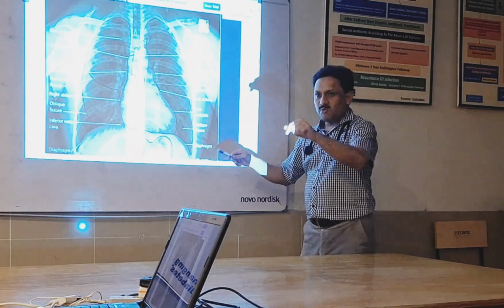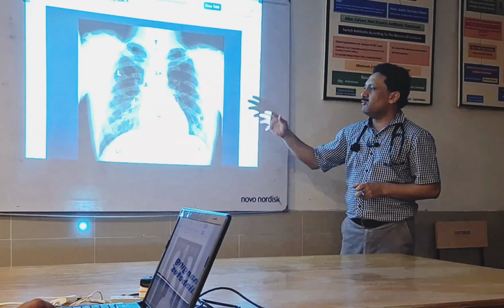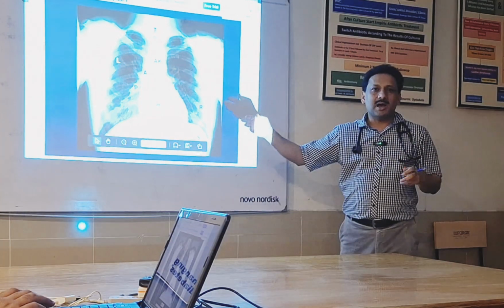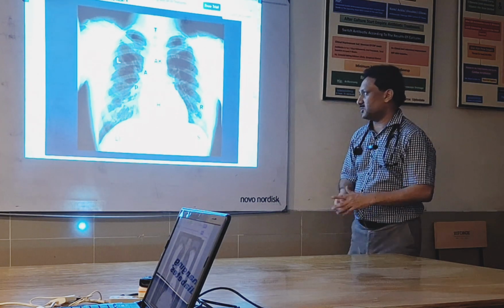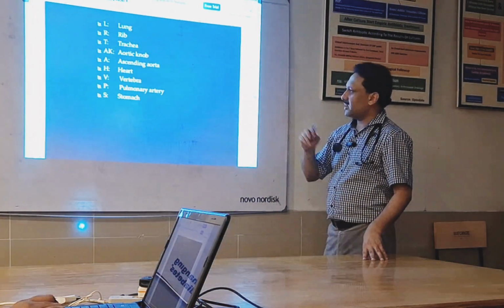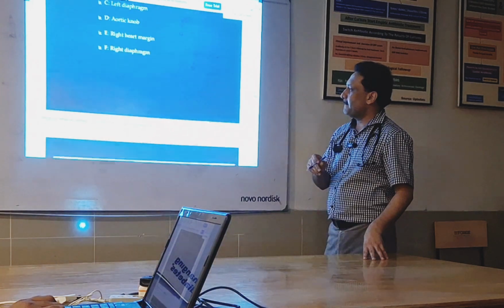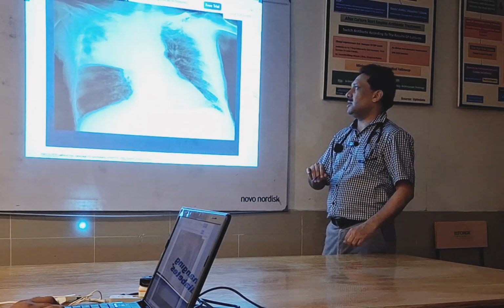Now move on. Now we would be focusing on certain X-rays, and we would be seeing, based on what we learned till now, what the different sorts of problems are. I would be sharing with you some of the common X-rays, and then we'll be discussing those X-rays. Move ahead. Move ahead again. Again, move ahead. Okay, just stop there.